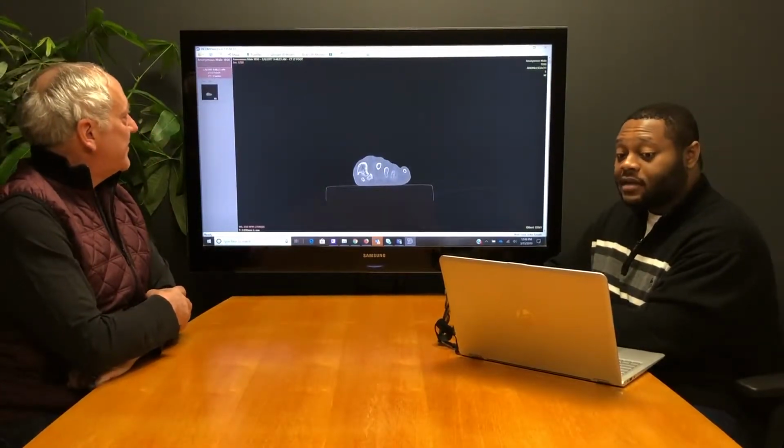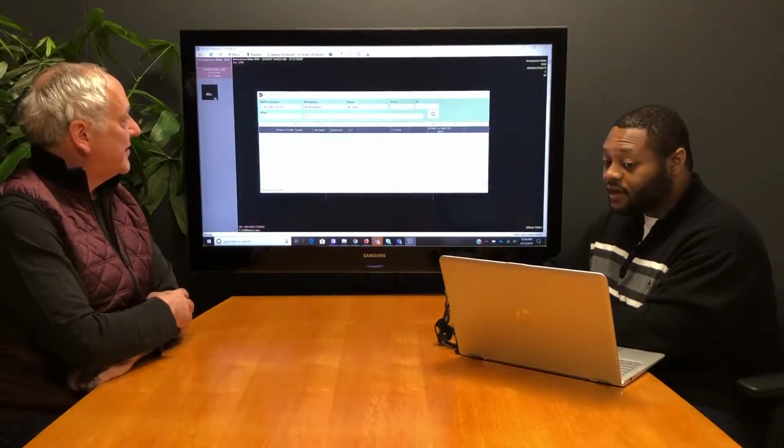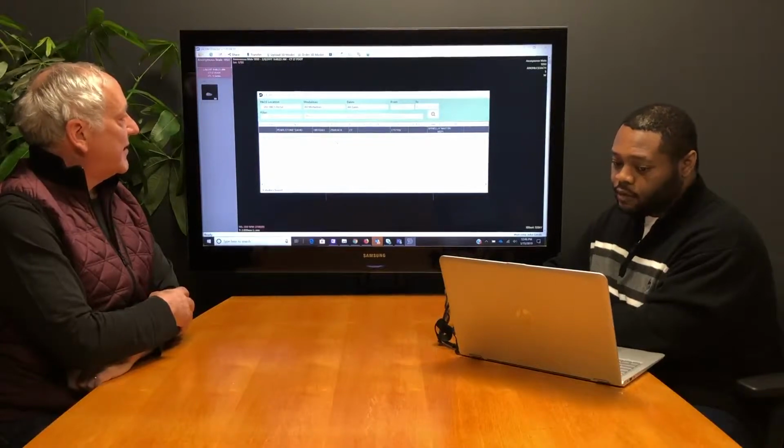All right, so now that our PAC server has our model, we should be able to find it when we go over here and actually search through our available PAC system. We're then going to double click on whichever one we'd like to load. Okay.